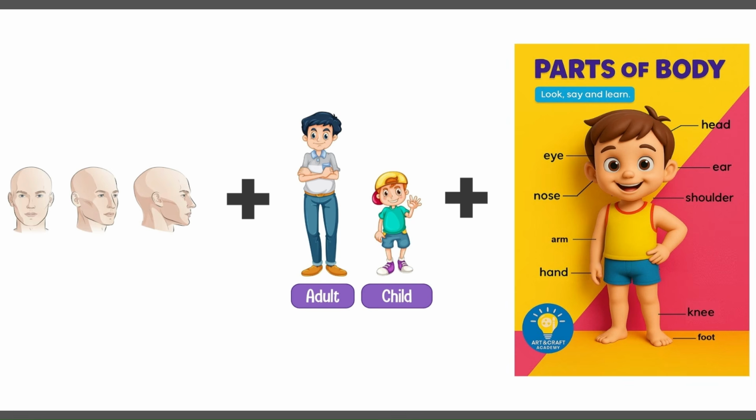Here's the framework. Follow along with me. We'll call this talk Crush X-ray Rounds. Now, when you get called on, the first sentence that you speak has to be very clear. And the first sentence has three parts. First part is what view are we looking at? Usually AP, lateral, or oblique. The second part tells us, is this an adult x-ray or a child x-ray? And the third part is what body part are we looking at?